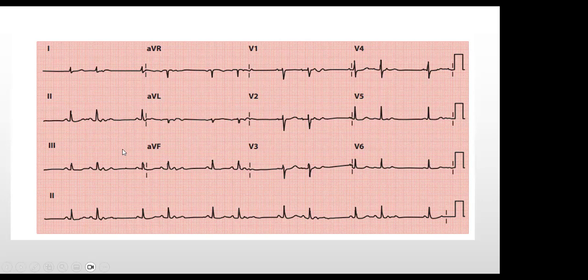But sir, if I may, the first speaker talked about premature atrial contractions, PACs. I do agree that there are PACs here. If you look at the impulses here, look at these impulses, and look at this. In terms of the heart, they are not even the same. The QRS complexes are looking different.